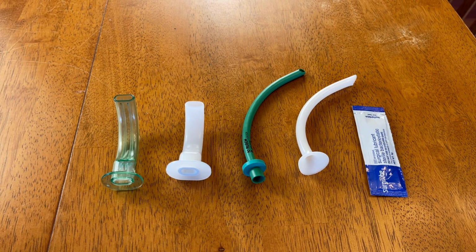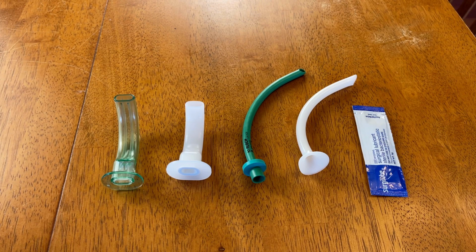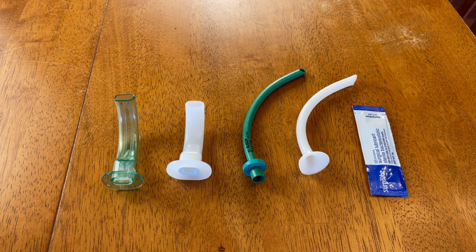Hey folks, Matt here again with another video where today we're going to be talking about some airway adjuncts. In particular, we'll be looking at the NPA or the nasopharyngeal airway and the OPA or oropharyngeal airway. The basic purpose of this video is just to become familiar and review some of the basic features of these devices as well as some of the indications and possible contraindications to their use.